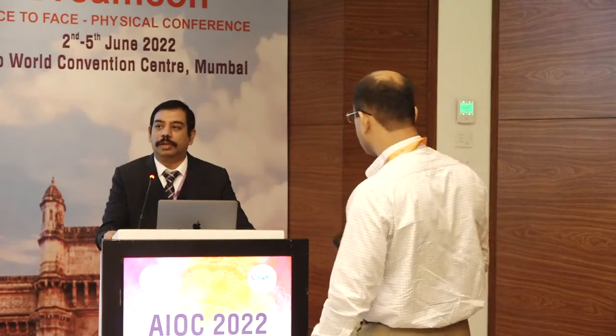Yeah, that's wonderful, Sachin. That's why we say to systematically go and see every zone. BMOC, if it is less than 100, it is okay, but we don't go up to 100. Somewhere around 20 to 50 average is fine, but beyond that is not a very good scan. So look at the B scans, look at the BMO points, whether they have been arranged properly or not. Look at the MRW, look at the ILM. Every zone you look at before you see the Garway-Heath or the Hood maps.